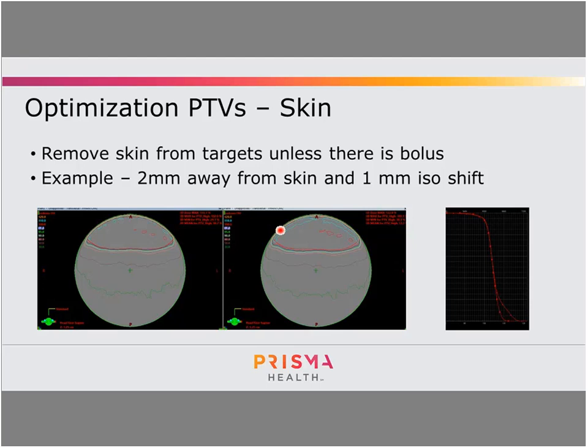On paper, it might look fine, but in reality, you have a very high likelihood of delivering a lot of dose to a patient if they move any. And if you ever want to test this and see if your plan is optimizing and pushing too much dose laterally or tangentially to the surface, in Eclipse they have that uncertainty tool, or the position uncertainty tool. Sorry if I'm saying the name of that wrong, where you can calculate the plan with a bunch of different shifts, and you can actually see that when you do this.